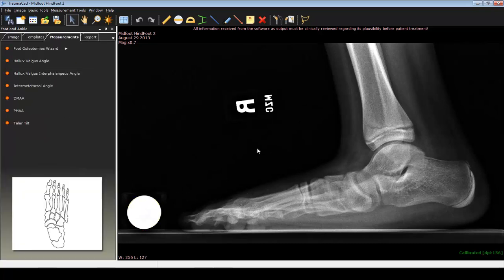In this case, we're not going to utilize really any of these options that are available to us, because the program itself allows you to be very flexible in how you use this program in deformity correction. And how I use it in the foot is I just use this main tab up top, which is the interline angle. There's certain foot and ankle measurements that those performing foot and ankle surgery are very familiar with, and I'll describe some of those before we do any correction.